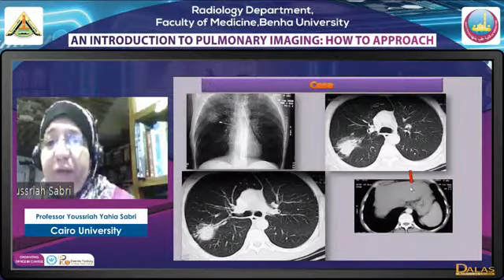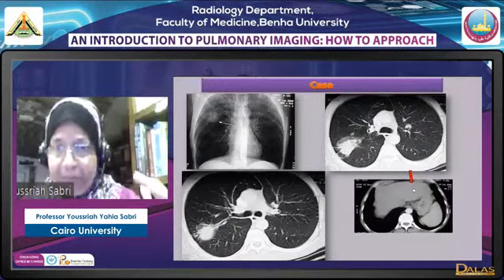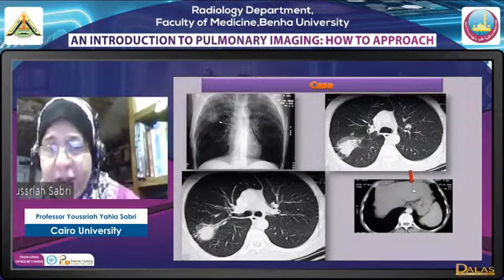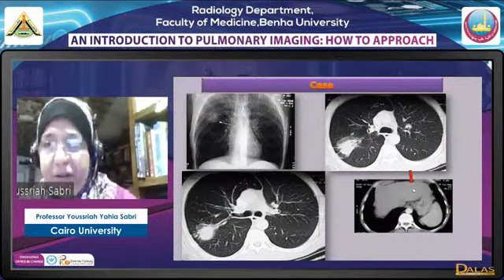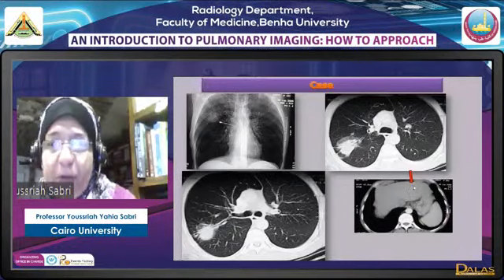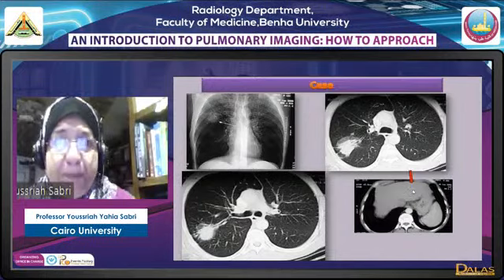في focal lesion في الليفر. will I consider ده هرفع الستيجنج بقى اقول ان انا عندي ميتاستاسيس؟ لا. الانسيدنتال ليجنز اللي موجوده في الليفر كتيره جدا، ف when I have a liver lesion تمام لازم يعني I will just describe it وبعدين هفحص الليفر نفسه بعد كده to assess لو هو ده ميتاستاتيك ليجن ولا otherwise.